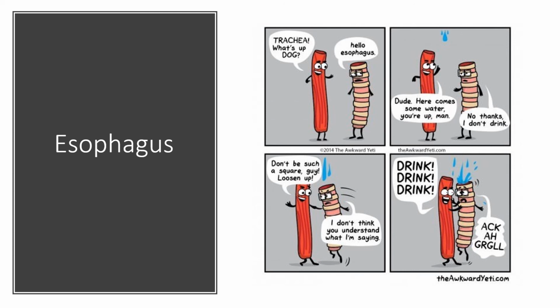Okay, A, B, C, D, E. E is esophagus. So this is something that's soft tissue. Remember, the soft tissue esophagus is not something that's normally going to show up on an x-ray. You will typically only see it if they're doing a barium swallow and it's a live x-ray. So that's something sort of different. You'll know about that when you get there.